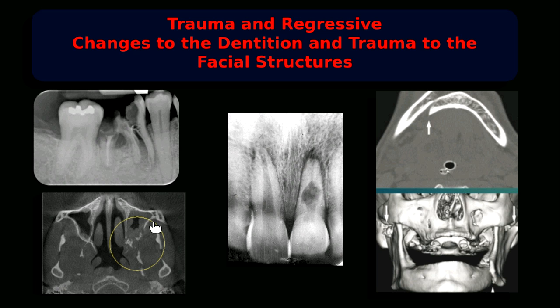Now, when you go here, you have this one. This is the axial view where you can see the left max sinus. It's broken. The sinus has full inflammation inside, and it's very aggressive and destructive. This turned out to be squamous cell carcinoma malignancy, that left max sinus.